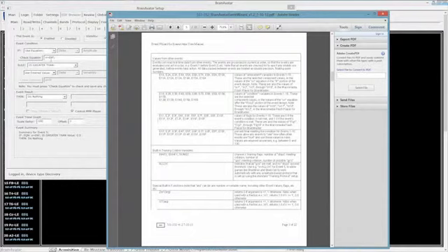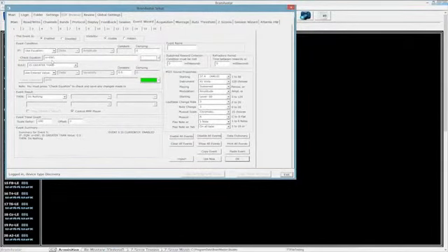E6F. If I go down here to where I see my Fs, E6F is the value of flags for events 1 through 16. These are 0 if the event conditions are not met, and 1.0 if the event condition is met. So what this is saying is basically EXF is a Boolean controller.